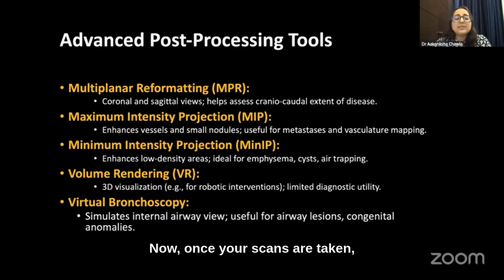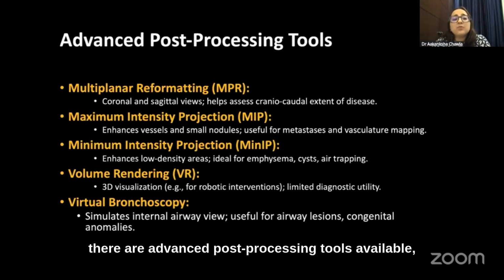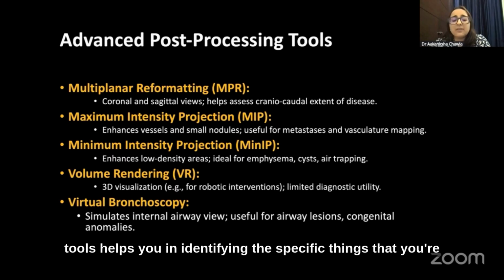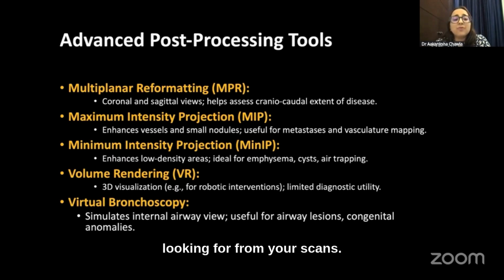Now, once your scans are taken, there are advanced post-processing tools available, which help you to identify specific extents, specific vascular mappings, cysts, air trapping, and other diagnostic modalities. So these specific processing tools help you in identifying the specific things that you're looking for from your scans.